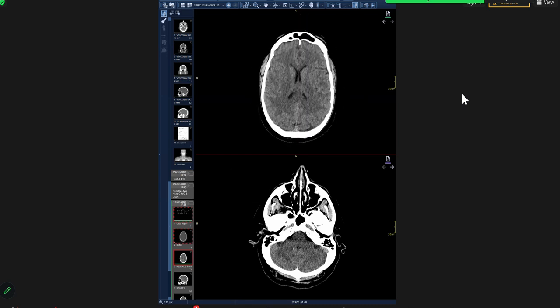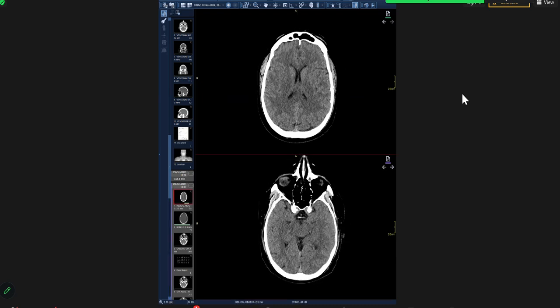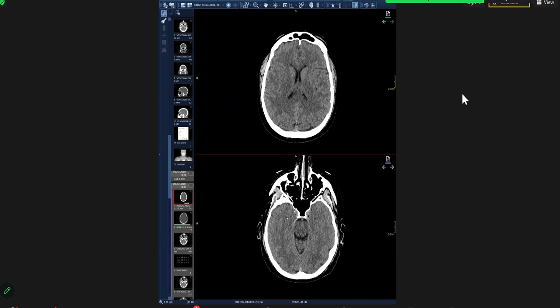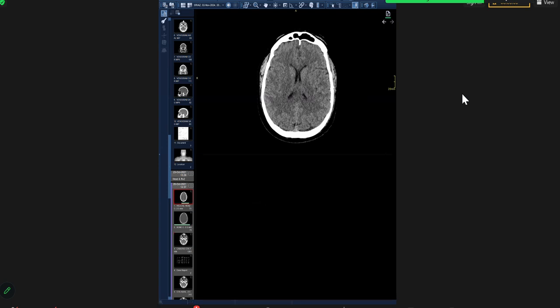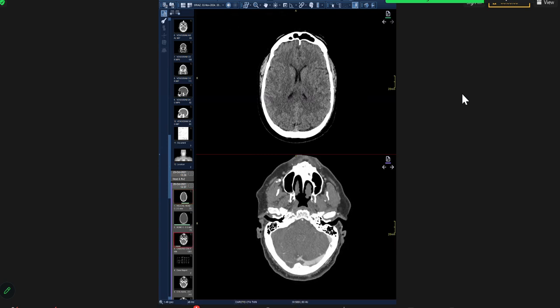Then on 20th October, the patient came again. The patient had such severe symptoms that they said maybe the patient has a stroke. So then they did the CT angiogram. Whenever you're reporting an angiogram, you have to look at the venous structures, even though it's not a venogram. This is the sigmoid sinus here, normally opacified, and the transverse sinus, and then you see it coming here to the confluence of the sinuses. Here there is non-opacification. See that?